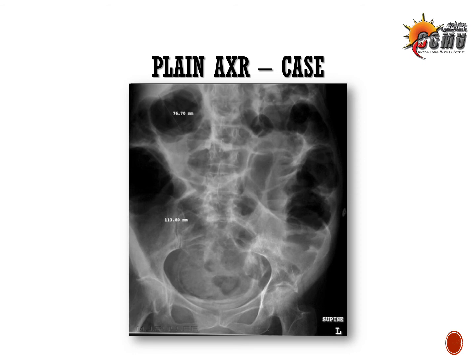So let's take this case of a patient presented with large bowel obstruction. He's had this plain X-ray film. If you want to comment on this film, this is a plain abdominal X-ray showing abnormal gas distribution in the colon, and there is increased gas shadow density in the midline to the outer parts and on the right side.